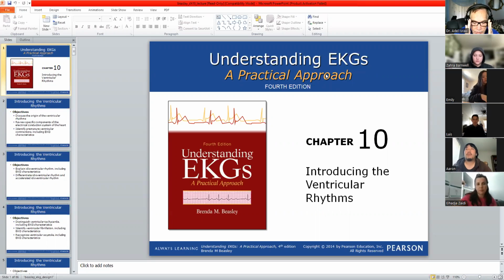As you know, ladies and gentlemen, in the morning session we did our chapter 9, which is talking about junctional rhythm. And we mentioned that the key word for us to understand this chapter is the word retrograde. And retrograde means what? Means negative. Why is it negative? Because the electricity is leaving the positive electrodes, so we will get the P wave all the time negative.